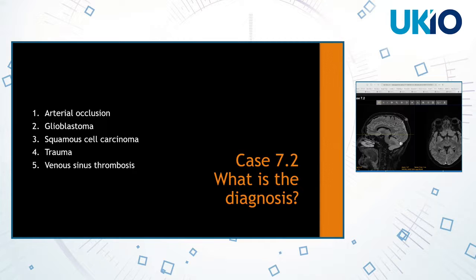I suppose the question here is, have you looked at the review area? Why has this patient had a venous sinus thrombosis? What's interesting about the thrombosis itself is it looks sort of chronic. There's all this T1 hyperintensity within the clot itself. Also hyperintense on FLAIR and T2. Not a huge amount of parenchymal change, and that left frontal swelling that we saw did not show restricted diffusion, so it's not an acute infarct at that point. So this all points towards a sort of chronic process.